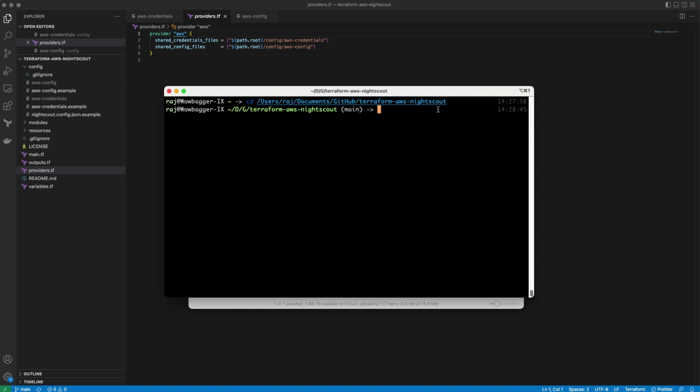Once we're in that folder, we need to do a little bit more setup. We need to create a special key that we're going to be using on our servers. And to do that, there's a command which is in the wiki. We're going to SSH key generation, and we're telling it where we want those keys to go, and that's inside of our config folder.